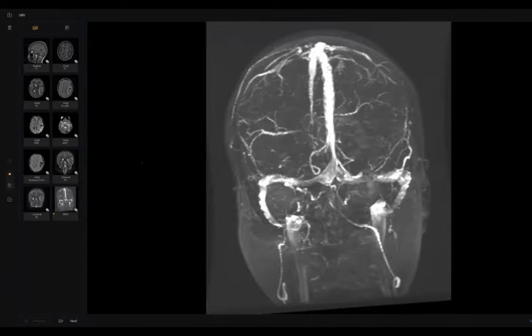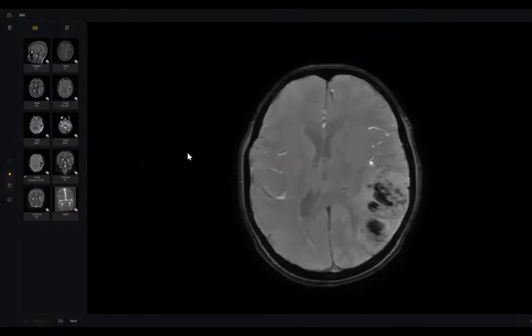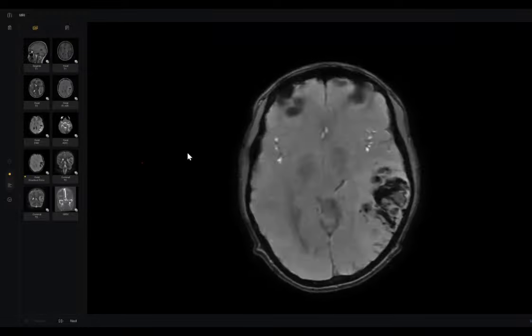So what's your differential? Others could be arterial causes, ischemia in that region, it could be territory of... Do you think real ischemia will be hemorrhagic like this? Look, like this. What do you think?